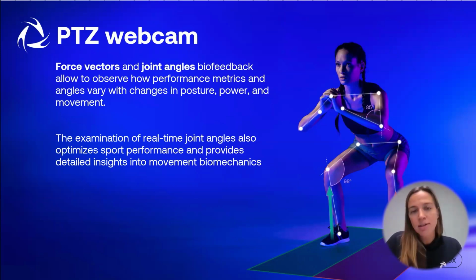And there is also the possibility to have joint angles body tracking in real time. In particular, the examination of real-time joint angles optimizes sport performance and provides detailed insight into movement biomechanics. This feature is still in development. It's something that we do have, and something that we are also working on to be optimized as much as possible.